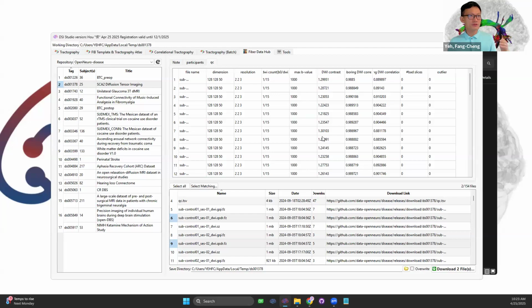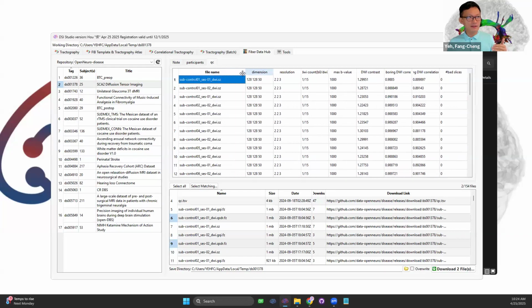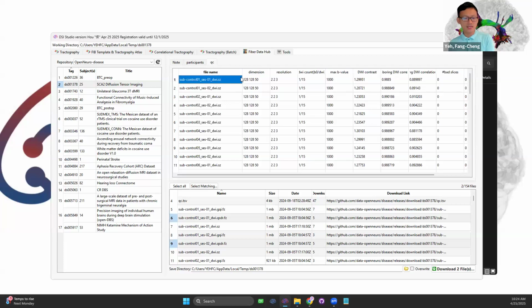But for most patients, if they are at a very late stage of the disease, all the tracks have anisotropy dropping a lot across the entire brain. So normalization doesn't really do a good job. Due to these two reasons, I found that the QA finding usually is not really reliable. But hopefully in a future version, we are going to correct for that to get the correct normalization. And once we've done that, we could compare the result of QA and FA.